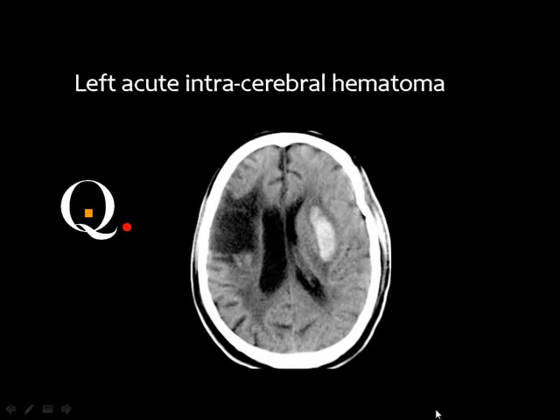Okay, yes. This is a good comment actually, and you see this area, which we call in the radiology reports an area of encephalomalacia. What do we mean by encephalomalacia? It is dead brain tissue, and the dead brain tissue may be the sequelae of infarction, trauma, surgery, infection, or a previous hematoma. Then how can you know which one of those it is? You should have the previous films and you should have the clinical data.